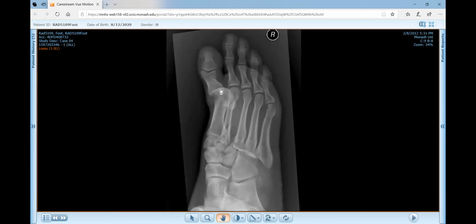You can notice here with the big toe, with the metatarsophalangeal joint, that there is subluxation there. But then also, if you look at the fifth metatarsal, that there is a subluxation. And the subluxation has occurred in the Lisfranc joint, which is this joint.